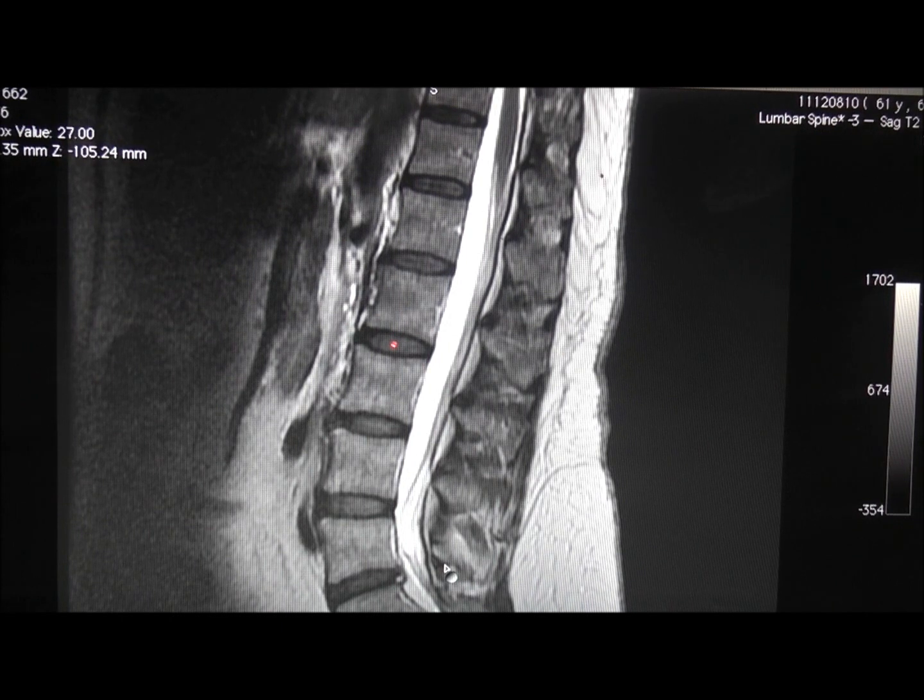And as you can see, this is a lady, 61 years of age. She presented in clinic with lower back pain. And I believe she had left-sided leg symptoms, sort of back of the calf, sole of the foot, etc. On the sagittal view, you can see what looks like a high intensity zone, possible annular tear at that level. But everything else doesn't look too bad.